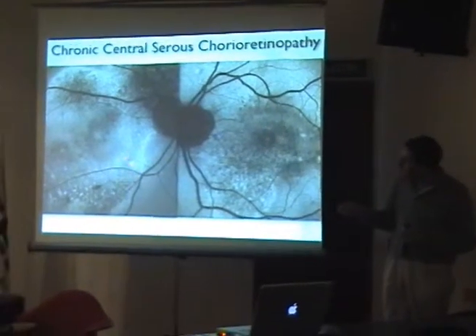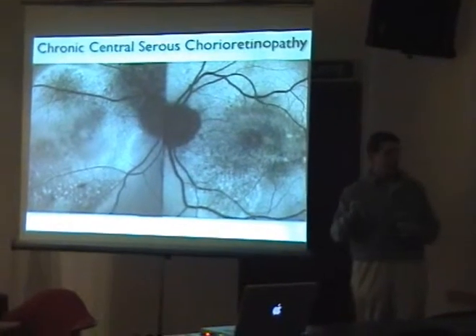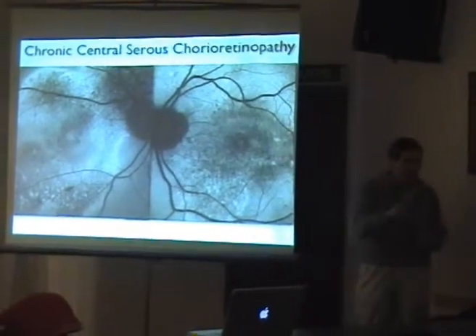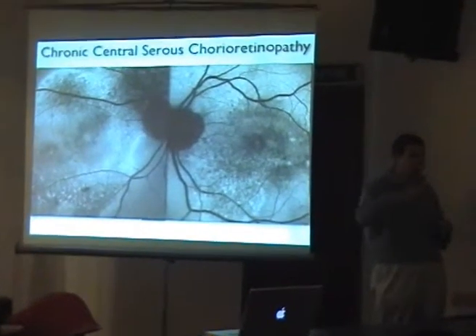Someone was saying that this is an increase of fluorescence due to the sick RPE cells. The fluid is there for a long time, and the RPE cells are not working very well, and then they accumulate photopigment. We have an answer right now because we had the spectral domain OCT coupled with an autofluorescent image, and it's easy. And why should it increase here?